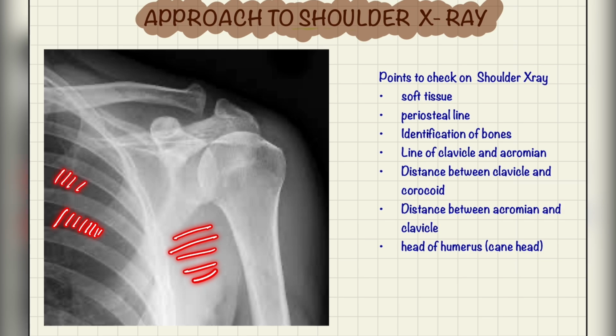We are also going to look at the intercostal spaces and the border of SCM and upper trapezius, and also the supraspinatus muscle.